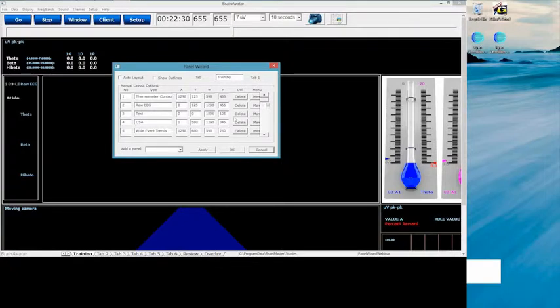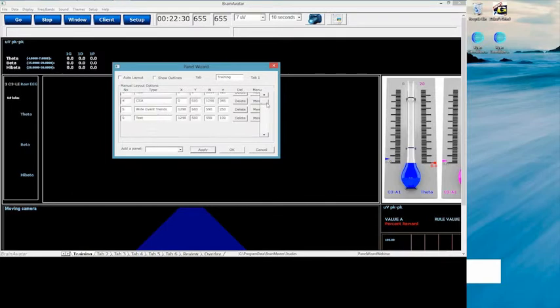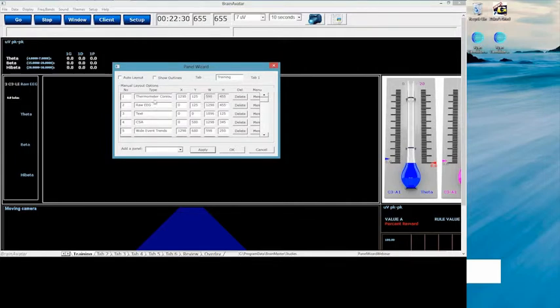Right here is where we are listing all the different panels that are displayed on this tab. Currently, there are 6 total panels displayed on it. And it's also giving you some XY coordinates, along with width and height information. The XY is basically the position on the screen of where it is, and the way it lays out is off of pixels.